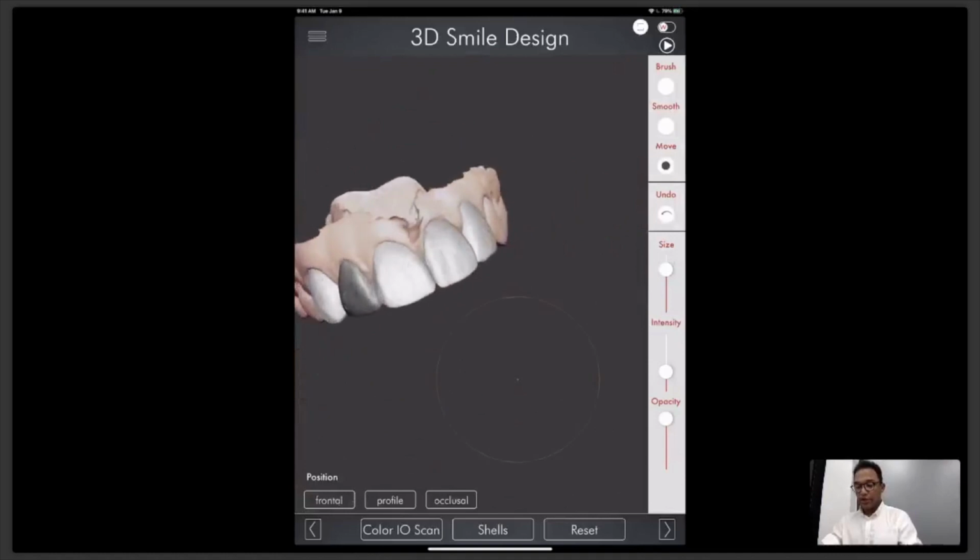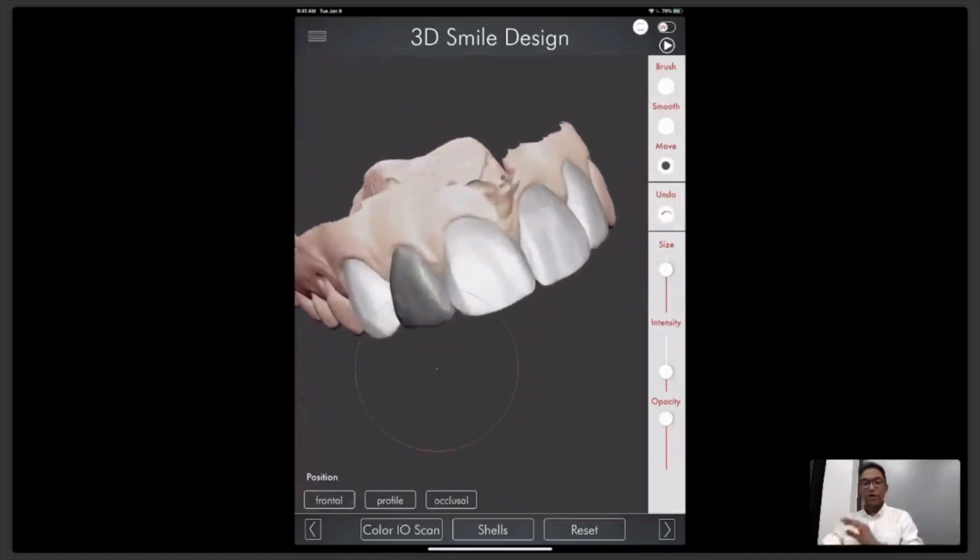All right, so here we have our mock-up, our motivational mock-up. It's here, beautiful. Now, what is the next step? Next step is to export this file and send it to printing. And I will swap now to my slides because this is a try me version and it's available to you in your app.